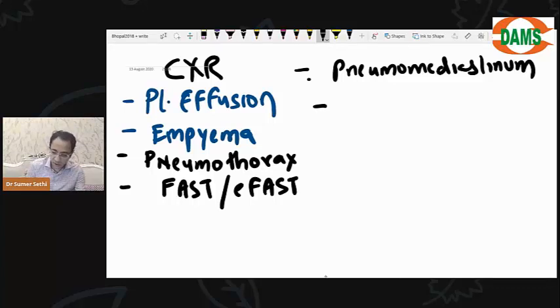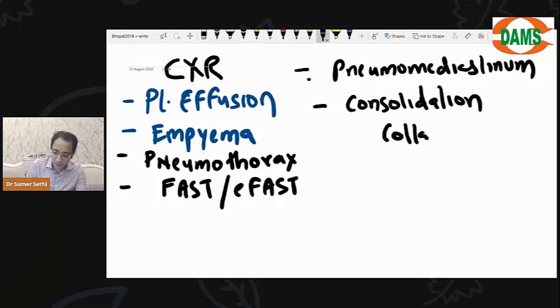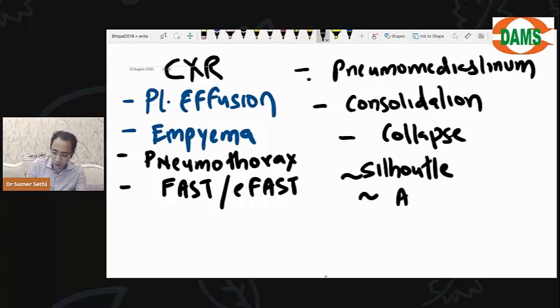And after that, if you remember, we discussed things like consolidation, collapse, and I told you signs like the silhouette sign, and we also discussed the air bronchogram.